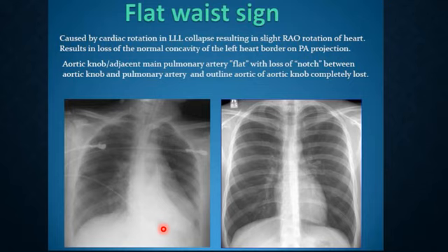We miss it a lot. And if you look carefully more, you can see the hyperinflated upper lobe compared to the right side. This is more lucent due to the collapse of the left lower lobe. So there are multiple signs to confirm left lower lobe collapse, and again, if you are not careful, you might miss it.